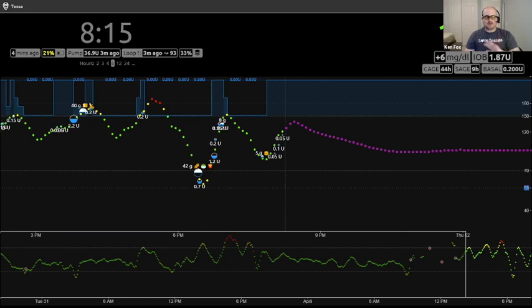So when you're looking at your graph, either in the big section here or across this 48-hour mini graph on the bottom, these colors are meaningful to tell you something about where you are in terms of where you want to be, and where you might want to take a look at something that didn't go quite the way you wanted it to. So make those colors useful by setting your targets. So yeah, most obvious, you can see it's capturing your CGM data. That's easy to see.